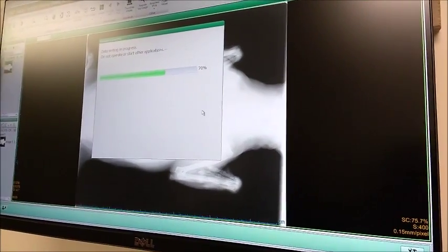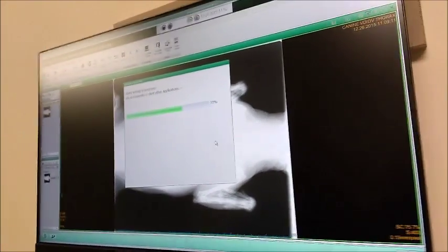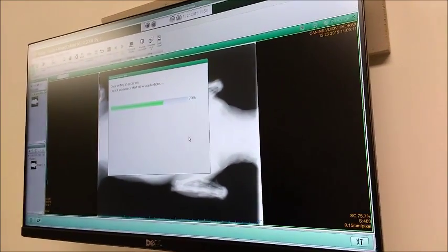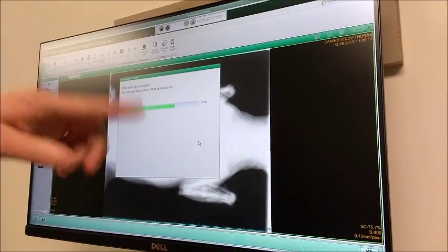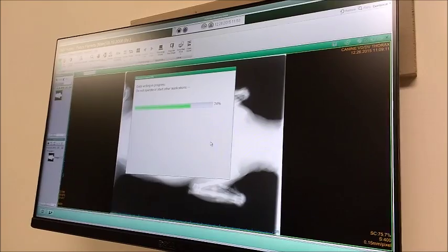And what is it writing? It's writing this image, a DICOM image, to the disk. With a DICOM viewer, so it will have a viewer. So if you send it home with your client, they'll be able to put the disk in, and it's actually very similar to this viewer. Wow, yeah. It's a nice feature.